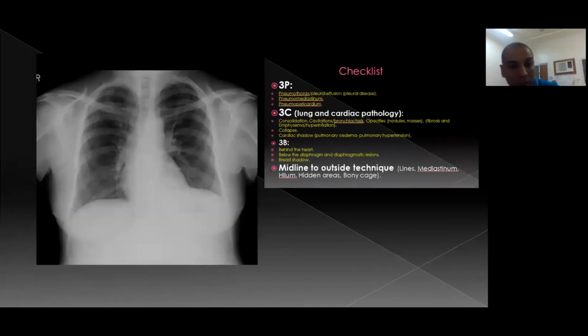Okay, this one I think is one of our difficult chest X-rays, so I will take a hand in this one. If you go here to the pneumothorax, you don't have any pneumothorax. Pleural effusion, because we are talking about the pleural diseases, one of the most important subtypes of pleural effusion is what we call subpulmonic effusion. And this is subpulmonic effusion. If you go to this left diaphragmatic copula, it is elevated more than the right side. This is one of the abnormalities.